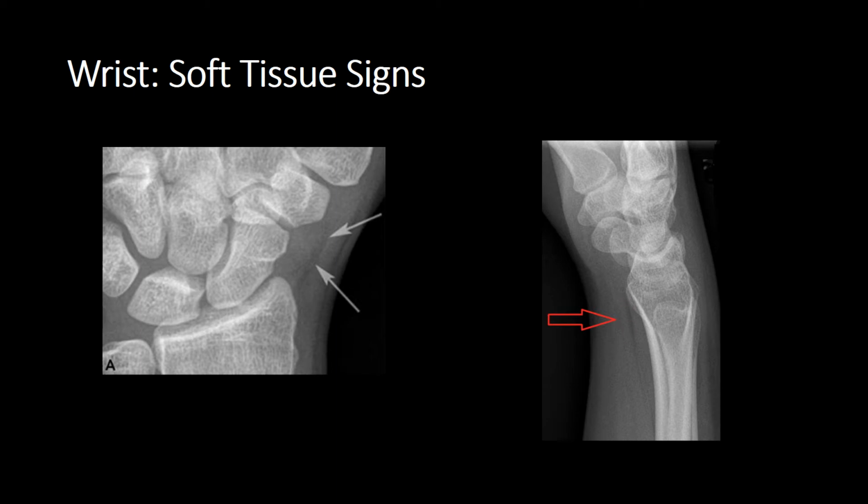Now what happens is that if you have, for example, an underlying fracture to the distal radius, you can then get some bulging of the pronator quadratus fat stripe, or even complete obliteration, and that's because of the haemorrhage of blood escaping out into the surrounding soft tissues with the fracture, causing this fat stripe to bulge or be obliterated. So this is a much more helpful indicator to raise the possibility of potential underlying abnormality.